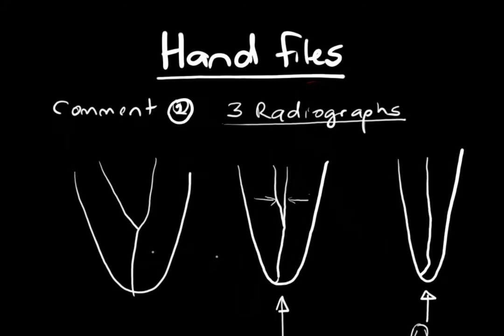Now 3, you'd never see this angulation because it's in the sagittal plane along the jaw, and you'd only see this with a cone beam, CBCT. You can actually start to see the structure radiographically in the other plane that's not visible.